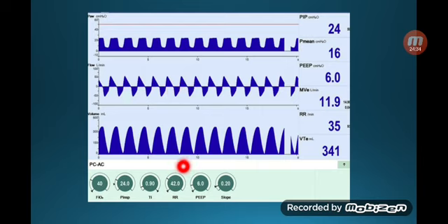And to be honest, any patient who needs an I time of 0.9, then usually I would say the age here is not an infant. So a respiratory rate of 42 seems a lot of rate for this patient. And I think they're trying to fix the high CO2 by increasing the rate. But in this case, they're actually doing the opposite, because they're increasing the rate to the point that they're not giving time for the CO2 to go out. So they're actually accumulating CO2 by not getting the rate down. Okay, does that make sense?